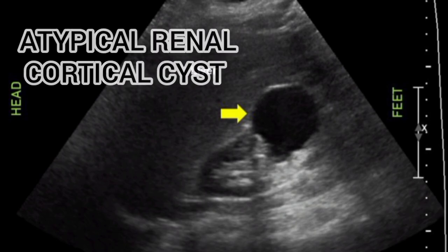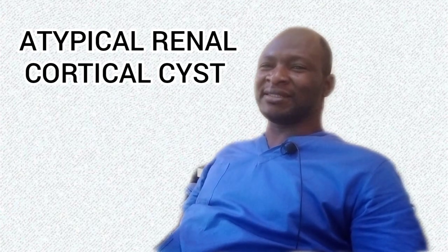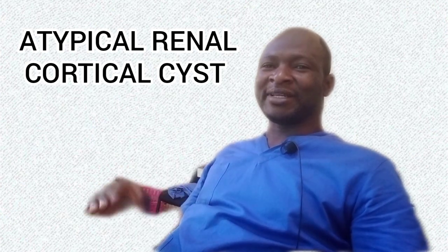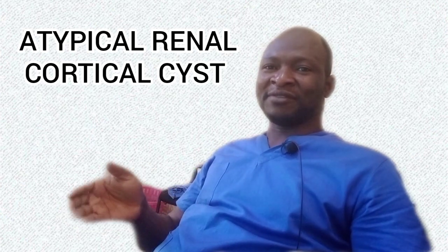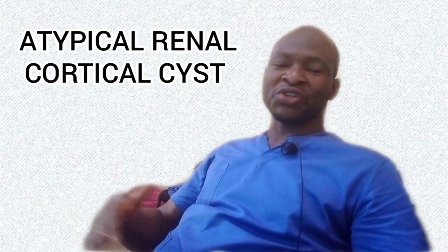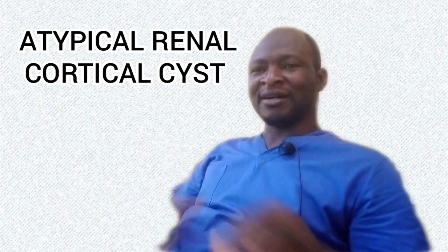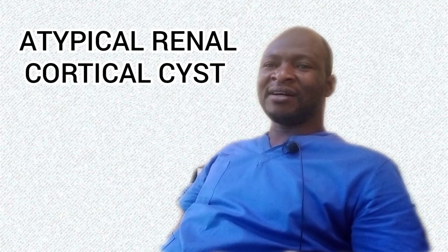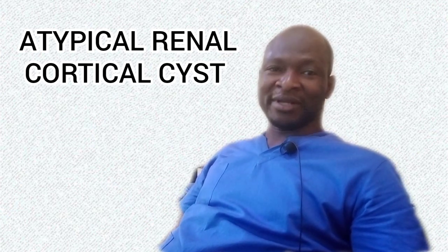Now, there is also the atypical renal cortical cyst, which does not meet the criteria of a simple cyst in the strict sense. They are simple cysts complicated by thick walls and may show thin septations, and sometimes they may have low-level internal echoes that are associated with either hemorrhage or infection. The internal echoes may be diffuse or show dependent layering. The cyst wall may also be calcified. These are considered benign findings if all other ultrasound criteria for simple cysts are met.